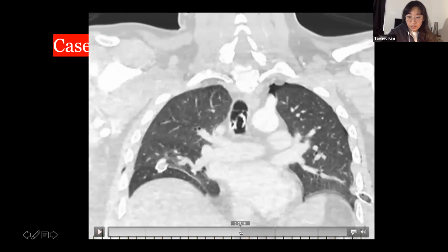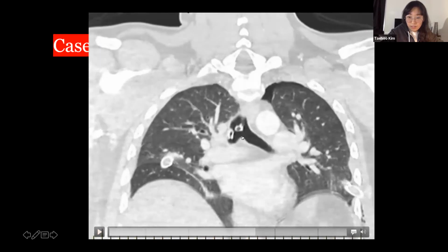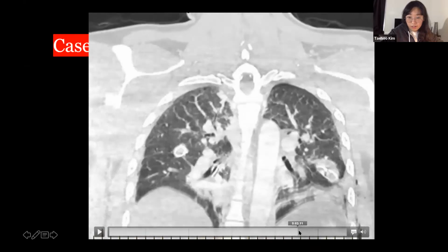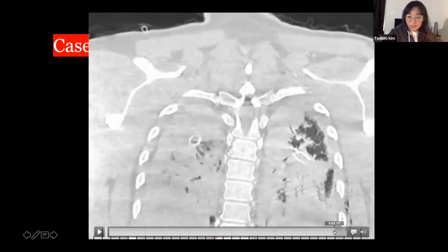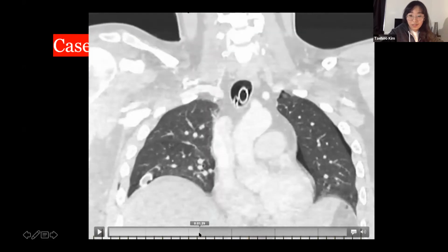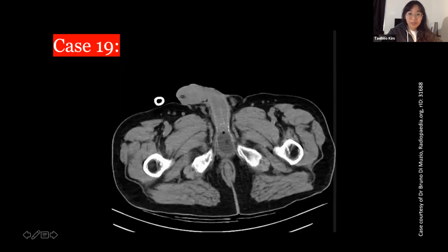And you see where it's going, follow, follow, follow. So the ET tube terminates above the carina, and follow this one. Going all the way to the right main bronchus to the posterior segment of the right lung. The tip is right here. So that's one way to confirm the positioning of the NG in trauma cases. I thought it was cool.